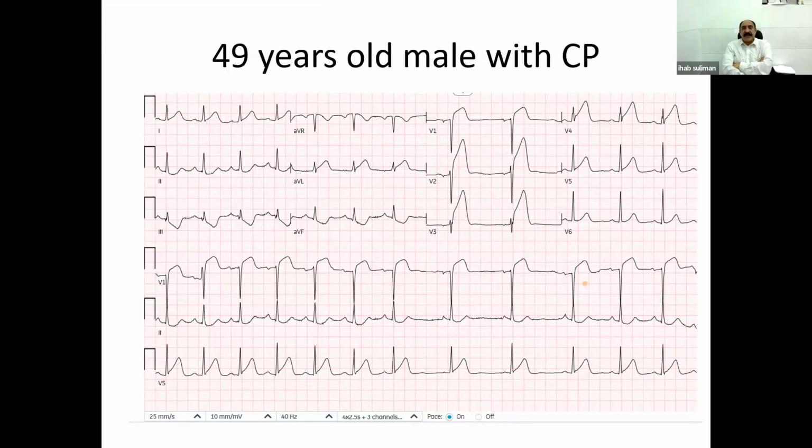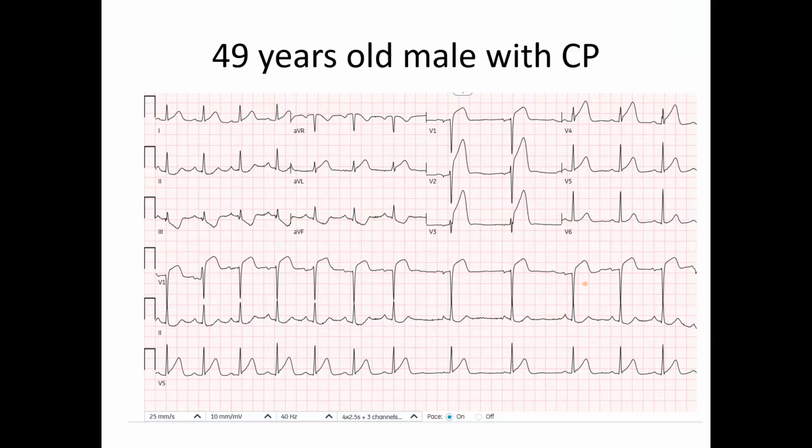Where is the ST elevation on this ECG? And there is a phenomenon noted on this ECG. There is a physiological phenomenon noted on the ECG, and where are the ST elevations? Anybody would like to comment on the ST segment? V1. It is V1. V1, V2.